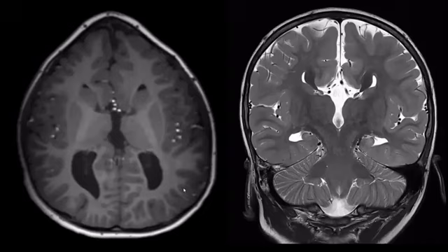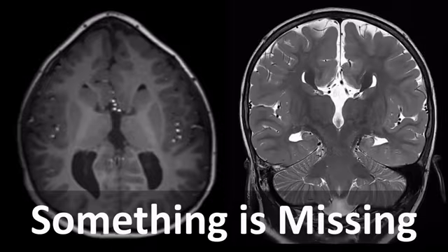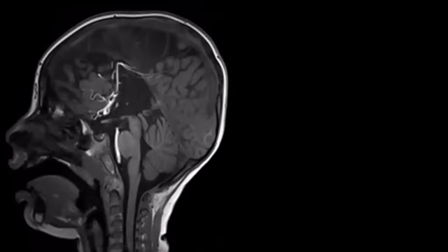This is another sign that I believe is something we all know or should know as radiologists. Something in this patient is missing. I think everybody immediately recognizes, even if you don't know this entity, something is abnormal. The ventricular morphology looks abnormal, both on this axial T1 weighted image and on this coronal T2 weighted image. What is the reason for that? Well, something is missing, something is absent.